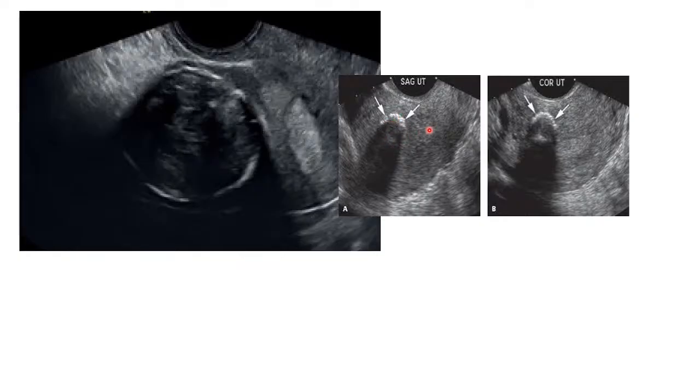So those are the things where you need to give differentials depending on the history, that you are seeing a calcified lesion in the uterus measuring this much by that much. Provisionally, that can be a calcified fibroid. Differentially, it can be a foreign body. If there are retained products like cotton during operations, you can also see them like that, or what we call textilomas or gossypibomas.